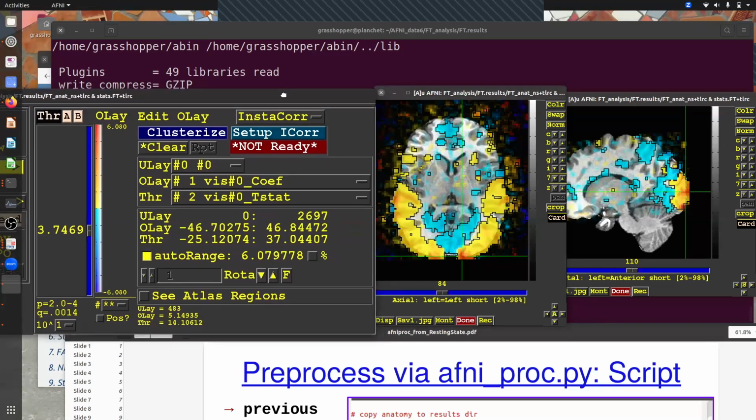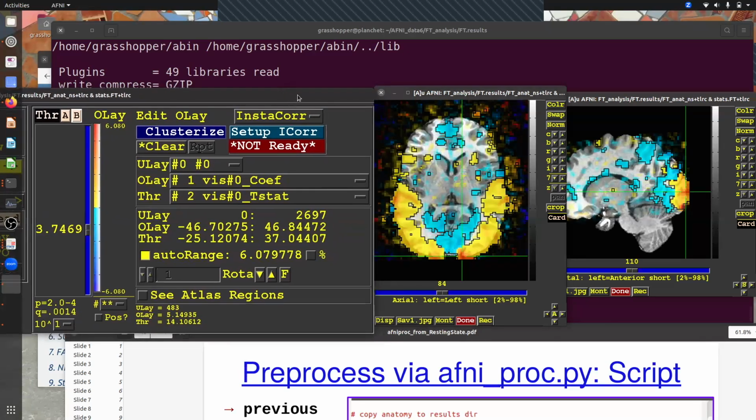Another thing to look at here is we're looking at percent signal changes of blood oxygenation with fMRI. The color tells us the amount of BOLD percent signal change we're seeing. What should we expect to see in an fMRI experiment? Should we expect 20% BOLD percent signal change, 50%? How much should we expect it to change? There's baseline fluctuations. The brain is always moving. When we give someone a task, what do we expect percent-wise?